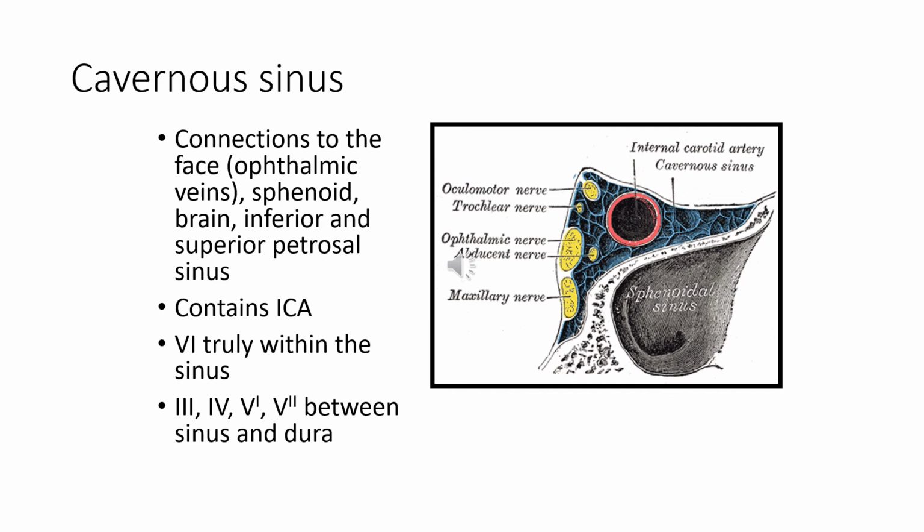Importantly, it contains the internal carotid artery, so this is the cavernous portion of the internal carotid artery that again we've seen previously on one of the CT slices.